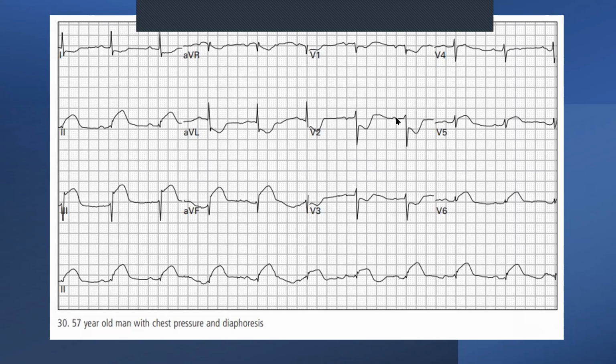But especially when you come here, you notice that it's actually quite a big gap between your P wave and your QRS complex. You're looking at about 6 blocks, and like we said, 2 to 4 is about normal, so about 0.2 seconds. Here we're coming closer towards 0.3, almost 0.4 seconds. So we've got a first degree heart block. Now, it's quite regular. It doesn't really change. So it is a first degree heart block in this case. All right, and then we look at the QRS complexes themselves.